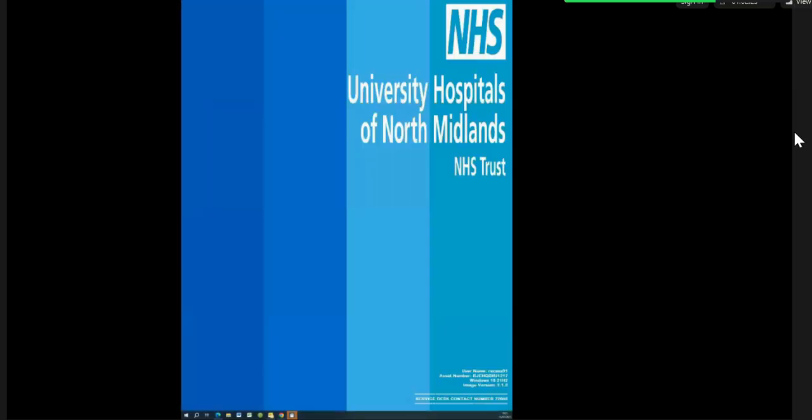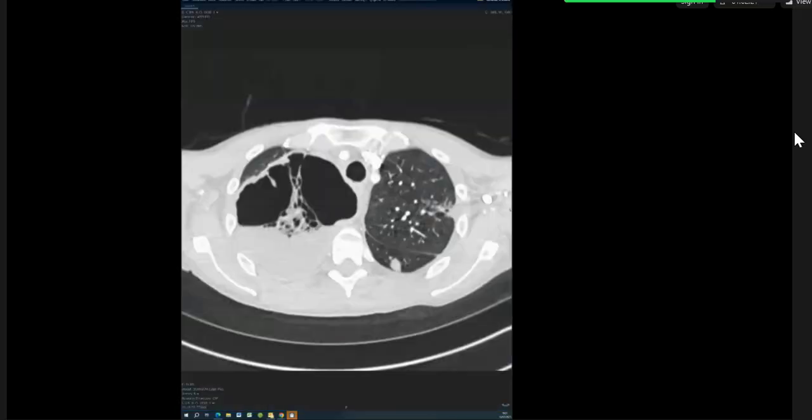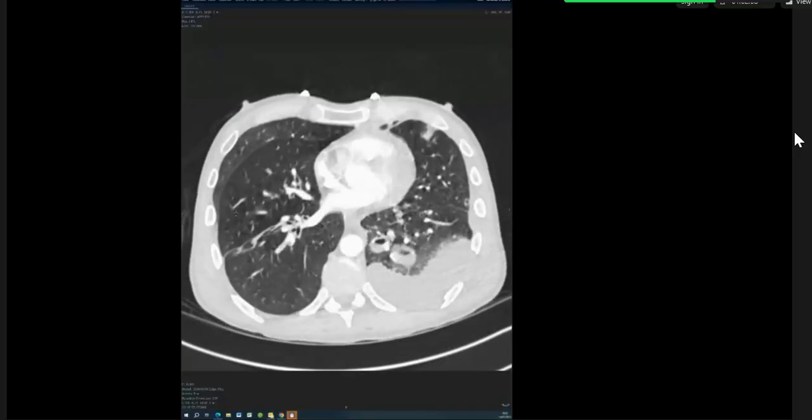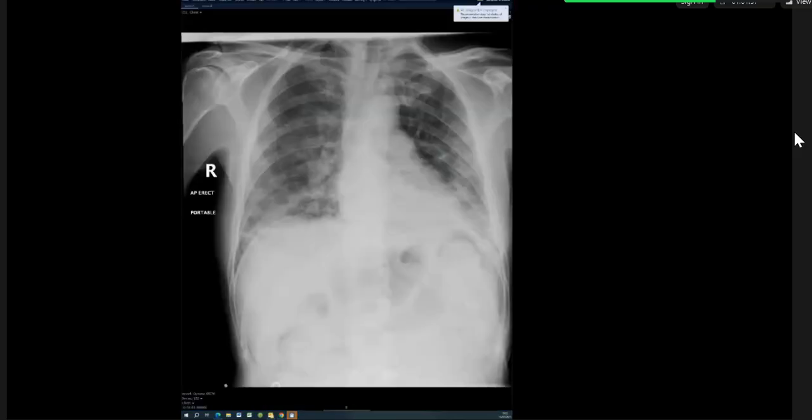Yeah. Well done. So there were extra points in there for PE, and for mentioning that this was thin walled and you were not suspicious for cancer. You would recommend further, depending on patient history and symptoms, an echo, which may be helpful to look for any cardiac abnormality. Let's do one more. Have a go at this one.